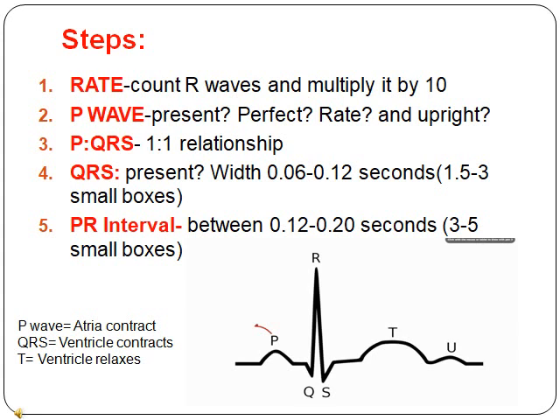And that's that. Just one last point: you have to remember in all the EKGs, like we said before, P wave, atria contract; QRS, ventricles contract. Why is this so important? Because let's say you go to step number 2, P wave. If it's not present, then what are we talking about? An atrial problem. So your answer is not going to be V-tach. It's going to be something like atrial fibrillation or atrial flutter. It's not going to be a ventricular problem. And the same thing goes for the opposite. If the problem is with the QRS, you're going to have a ventricular problem. It's not going to be AFib or A flutter.